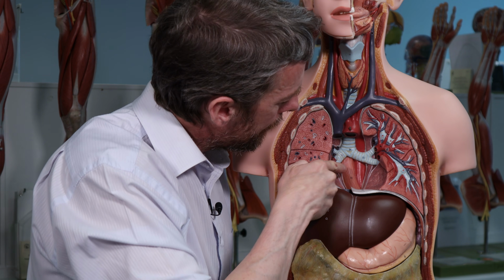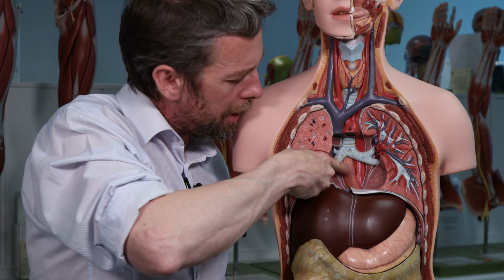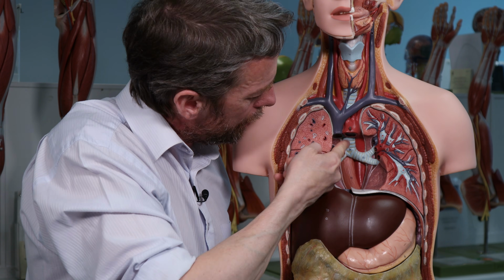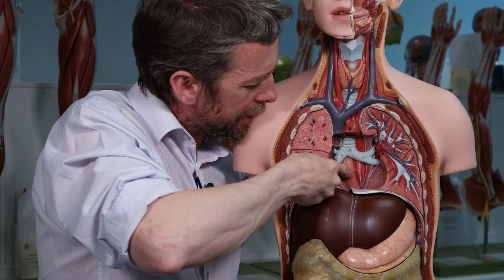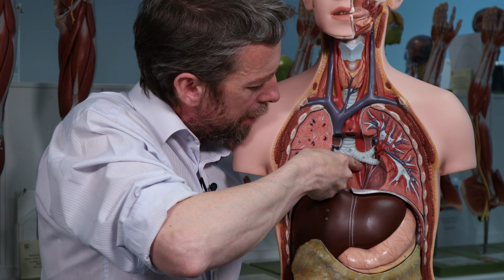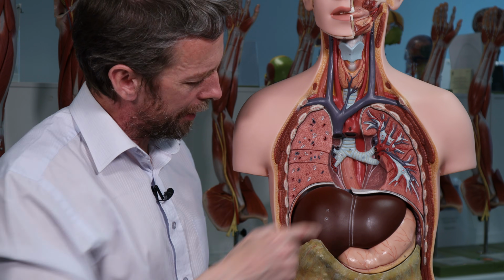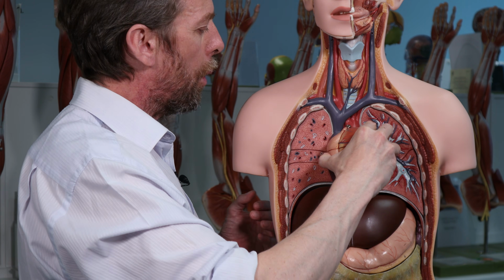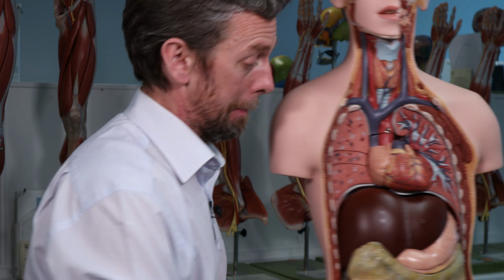Look at this, here's another muscular tube here, right next to the aorta. So the trachea will end at this level. This tube will continue down here, next to the aorta, and this tube is going to go to the left as it goes through the diaphragm. So this is the esophagus. I wonder if we can see that on the images.